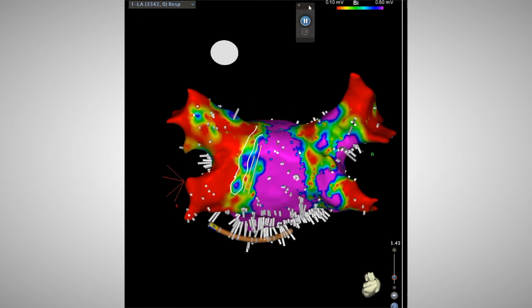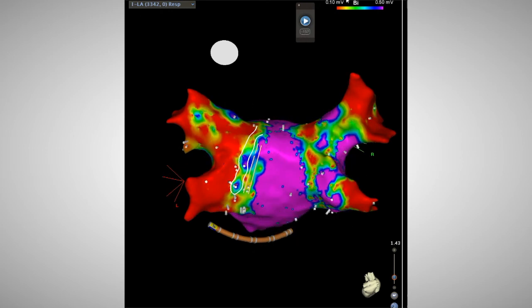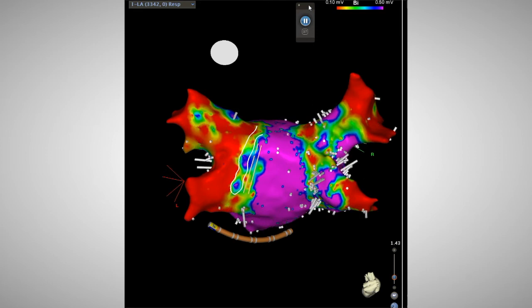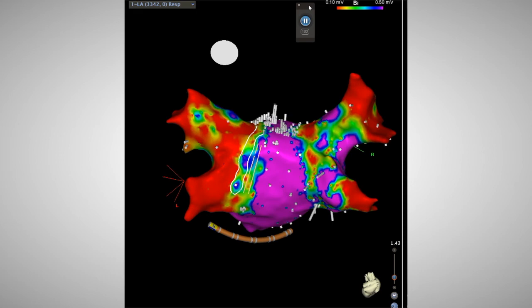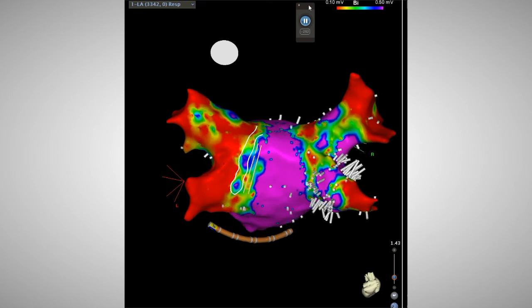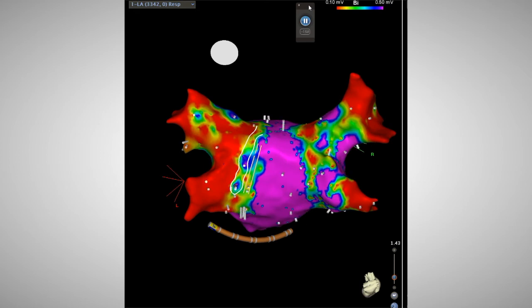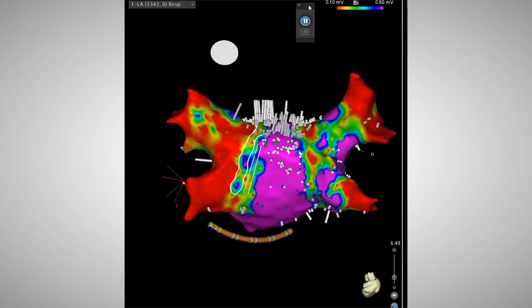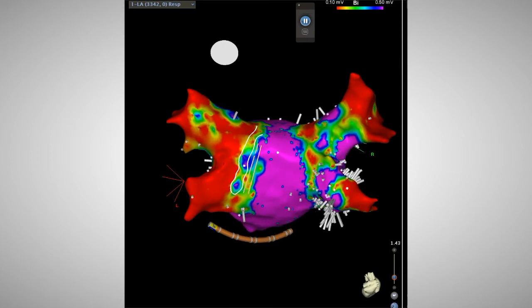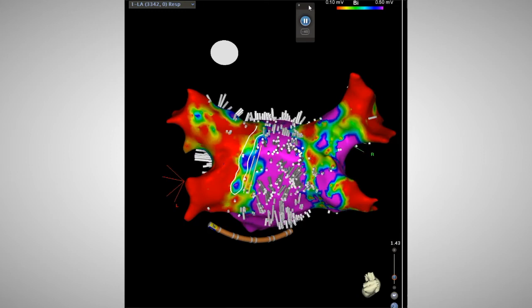But the true origin is a focal tachycardia from that left inferior pulmonary vein, and moving through a long stretch of corridor, a remarkable stretch of corridor, because of the prior ablation. Based on this, there must be a line of conduction block, which is illustrated by double lines in this video, a line of conduction block from the prior PV isolation procedure, but that allows for this remarkable tachycardia emerging centimeters away from its origin, one that would be quite difficult to appreciate in other ways.